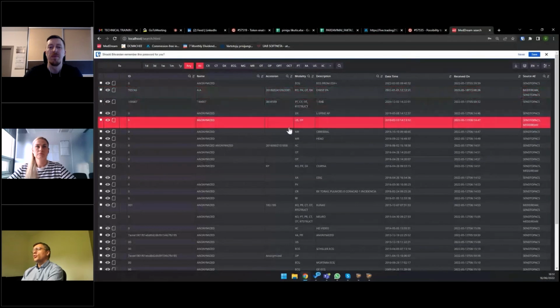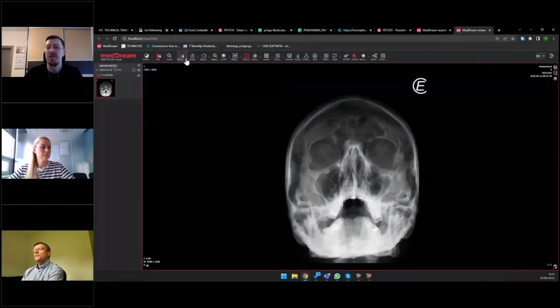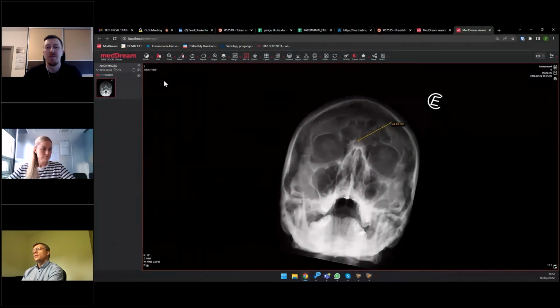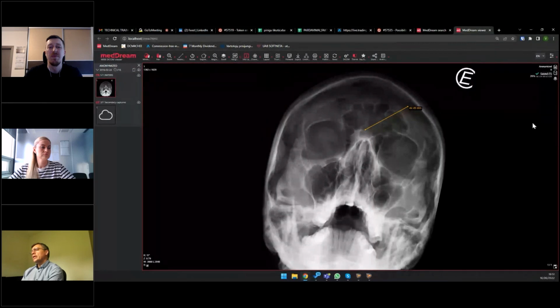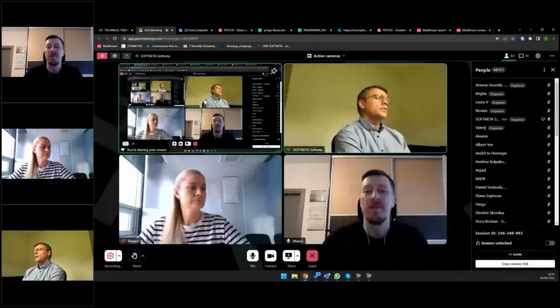I now just open any type of data, like some radiology. What we did in the newest version, which is already available, is that you can do some measurements or even zooming, rotation, any actions, changing of windowing, and then make a secondary capture. Secondary capture does exactly what was asked here. It creates a new image, stores it back to the PACS system, and you have all the same settings on that image. So I would say this is already done for existing data, but not for importing non-DICOM data and then converting to DICOM. For existing data, you could now save in most cases with the secondary capture. This is already available.